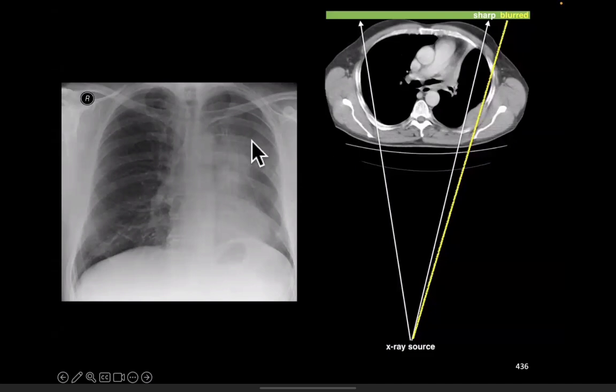And that's why it's so important to recognize whether it's a pulmonary lesion or an extrapulmonary lesion. It's all very well spotting the abnormality, but you've then got to nail it in terms of its anatomical appearance. Okay, so very important. And this patient has clearly got a left upper lobe collapse. There's a very subtle Golden S sign, the mass lesion causing the left upper lobe collapse.